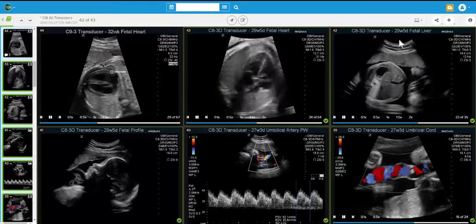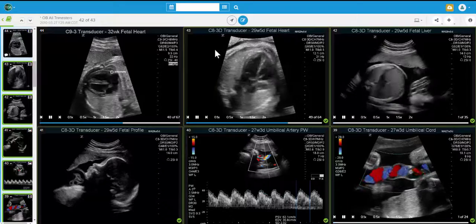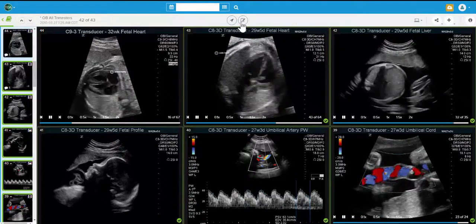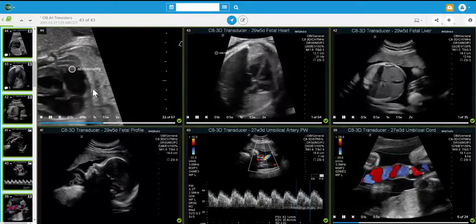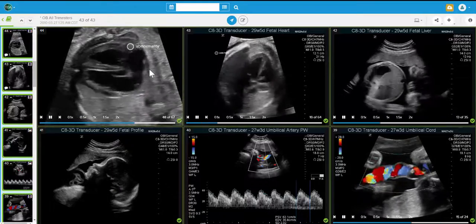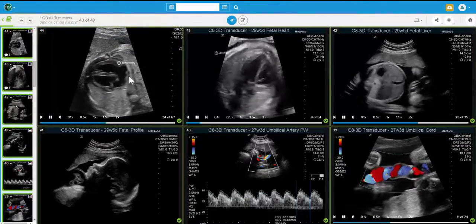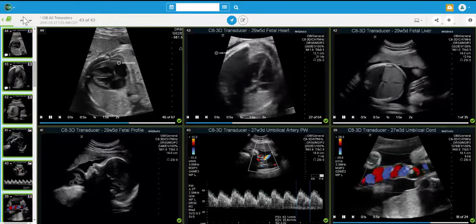While viewing, you may notice something you would like to make note of. By clicking on the small pencil icon and holding your mouse down for just a second, an annotation bubble will appear. Type in your annotation and click back on the pencil to save. Immediately to the left is the Zoom feature. Clicking Zoom gives you the ability to scroll in and out and move the image to get a closer look. Both of these functions can happen whether you have 1 or 16 images open.